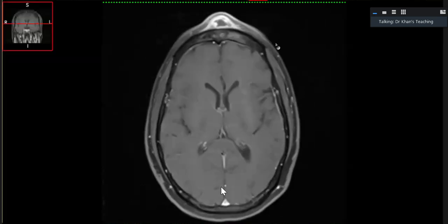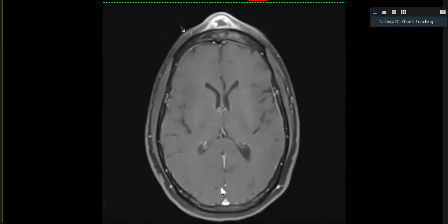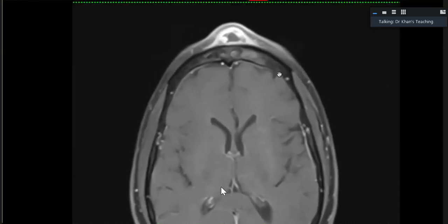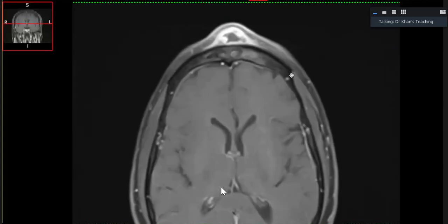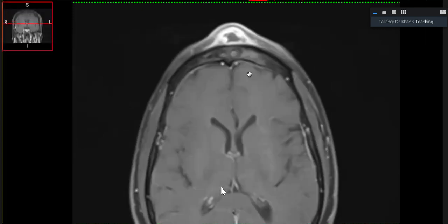And here, the key point is that keep looking for intracranial manifestations. They will always show you, in head and neck territory, favorite exam cases are infections with intracranial manifestations. So that should have been pointed out, even if there was none. But in this particular case, there is leptomeningeal dural enhancement bilaterally.